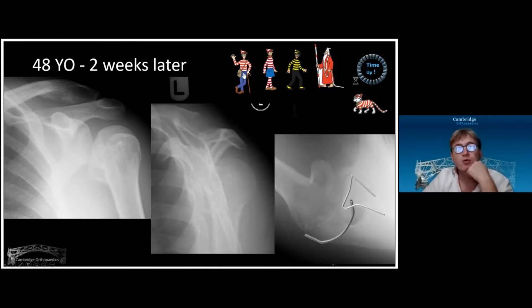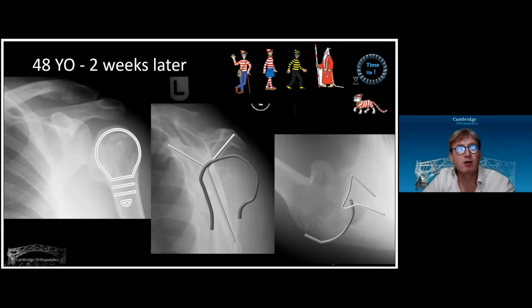Well, I hope that you would all have seen Wally by now. And so when you get a good axillary view, you can see the classic posterior dislocation of the glenohumeral joint. We see how the humeral head is posterior to the glenoid. Village policemen can make that diagnosis when you have a good radiograph. You might have noticed Wenda on the lateral scapular view, the humeral head posteriorly displaced, centered on the Mercedes-Benz sign. Odlaw and the light bulb sign, old school light bulbs. The Wizard shows us the relative increased distance between the glenoid and the humeral head.